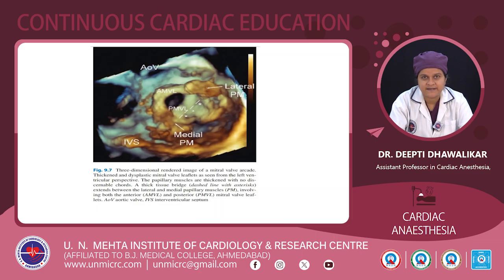So this is a 3D TE picture of the mitral valve from the LV aspect. So here you can see thickened dysplastic mitral valve leaflets along with thickened papillary muscles, and there is a fibrous bridge connecting both the papillary muscles, which is shown with asterisks.